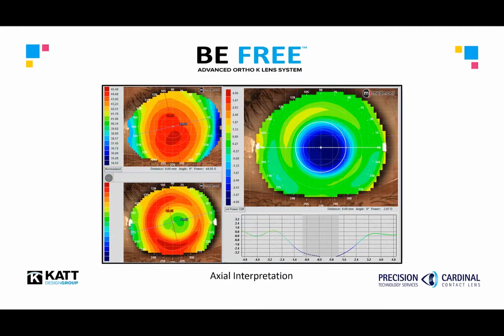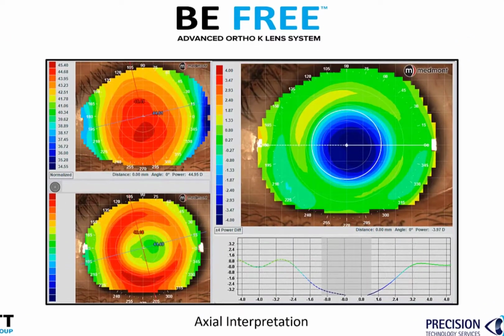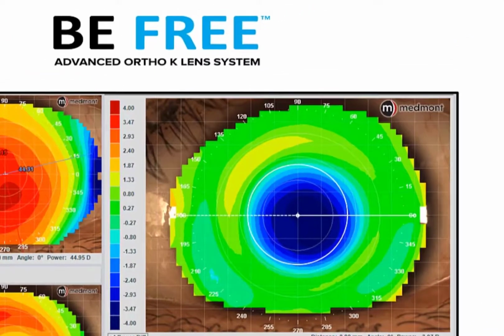Let's review the first of two cases and how easy it is to modify and improve the fit in the BE FREE software. Here we see a post-wear axial subtractive map which shows a blue treatment zone well centered to the white pupil margin.